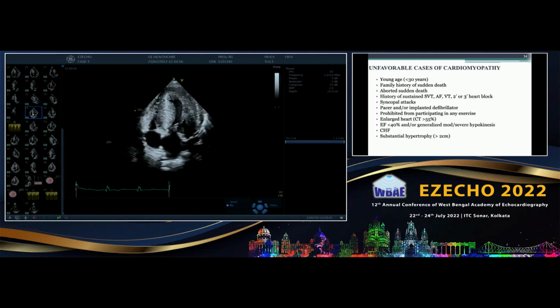Right. No need. I think they got it after Valsalva probably. The resting was 70, madam? How much was the resting gradient? It was 70. 74. It was, I mean, you can always do anything, but there is no.